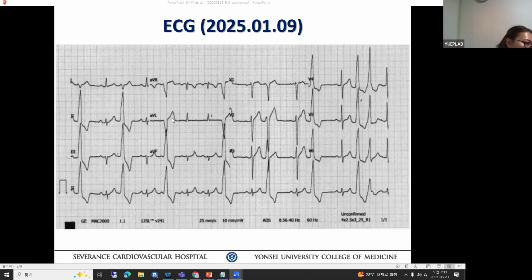So how about the QRS duration? D1, D2. Slightly, a little bit narrower. Okay, right. That's an important feature because if it's a septal side, you can activate the right and left ventricle simultaneously. Therefore, interventricular conduction time is going to be shorter, which is the sum of the QRS duration. So it's important to look at those features.